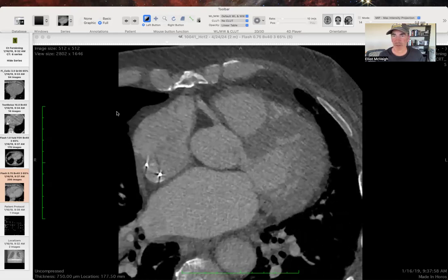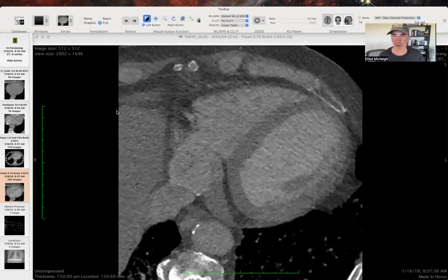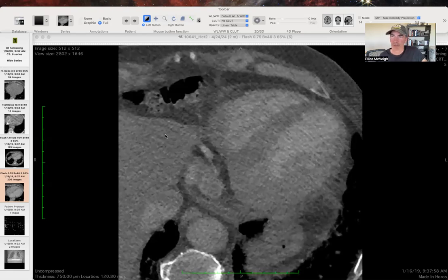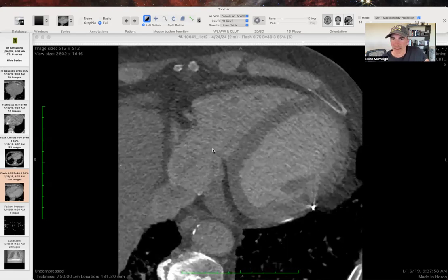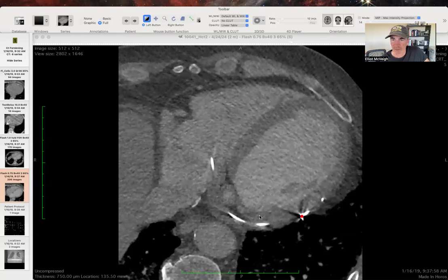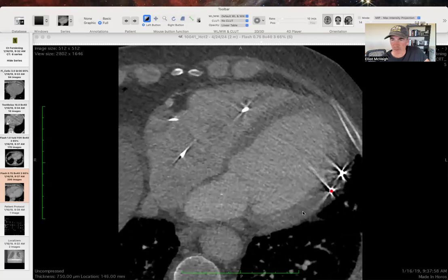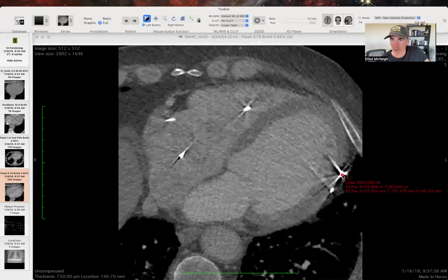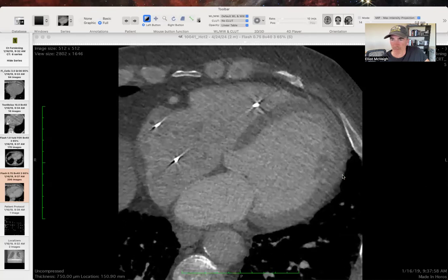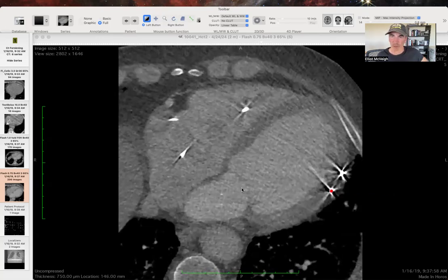And so here's an example of a case in which we've done the CT a few days after placement of the leads. And we can see here, down on this position on the anterior wall, is the left lead. So here's one lead there. There's one here and one here. These are the electrodes. It's all one lead. And so this is the most distal lead, which we call left lead 1. And then the second most distal here would be the left lead 2, etc.